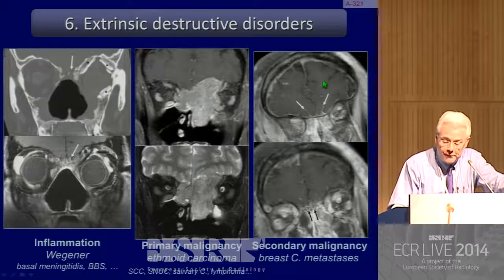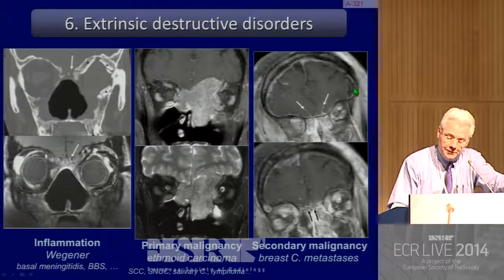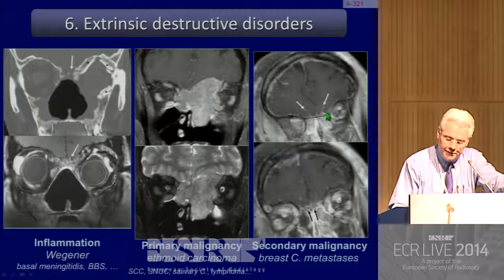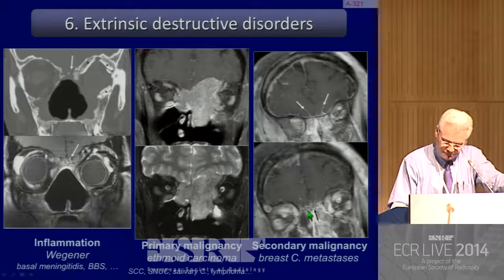And of course, you have carcinomatosis, you have meningeal spread of neoplasm, here a case of neoplasm of the breast with a complete encasement of the olfactory bulbs too.